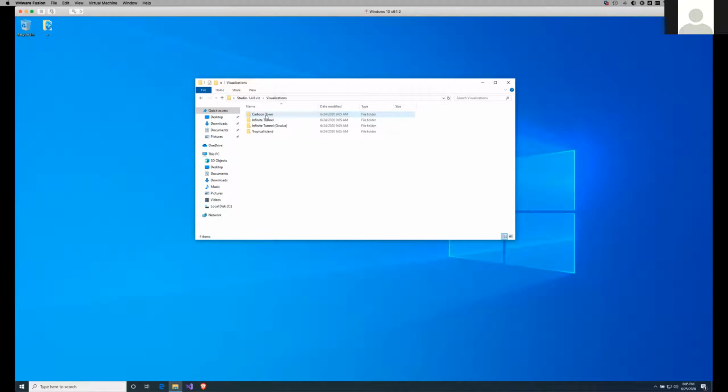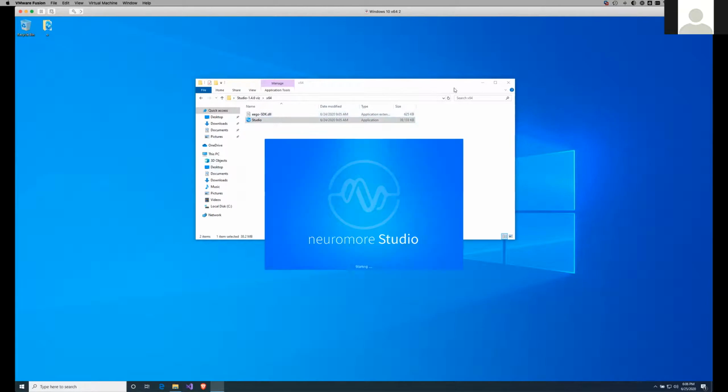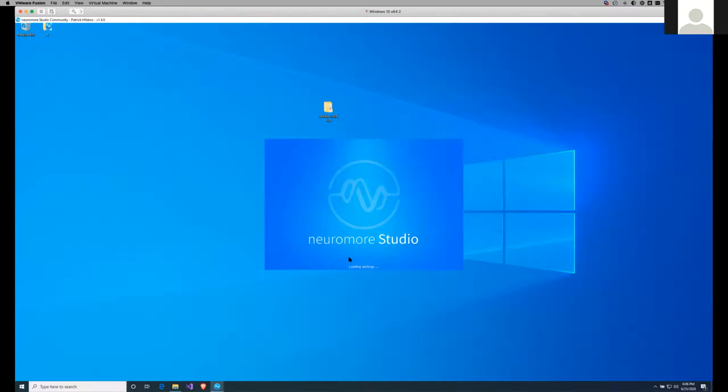It's a folder called visualization that contains 4 different visualizations. There's actually 3 different ones. One is Oculus enabled. It's for the DK2. And the other ones are just like simple visualizations that run without any additional VR headsets or things related to that. So if we open up, for me, I have a 64-bit version of Windows running. So I open that Studio version.